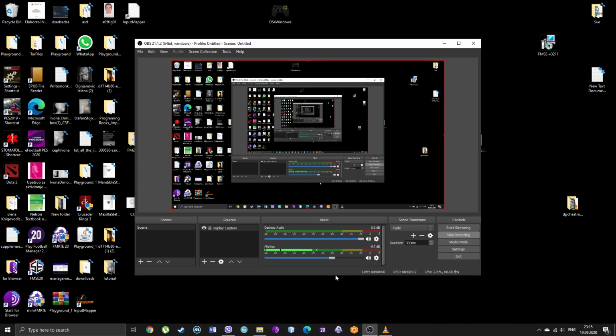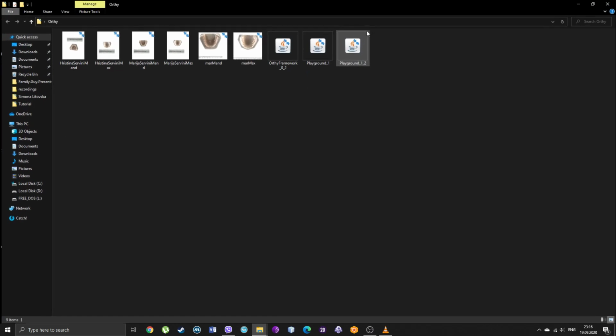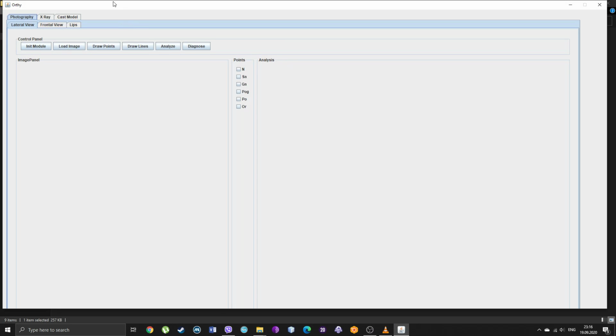Hi everybody, my name is Stefan and I'm going to try to make a short tutorial about the cephalometric software I made. It's homemade, as I said, so it's not complete.